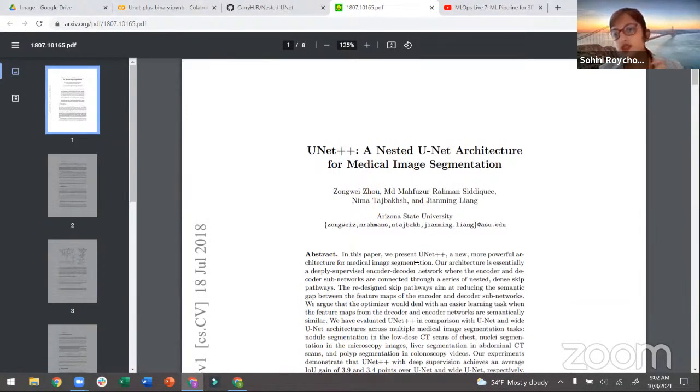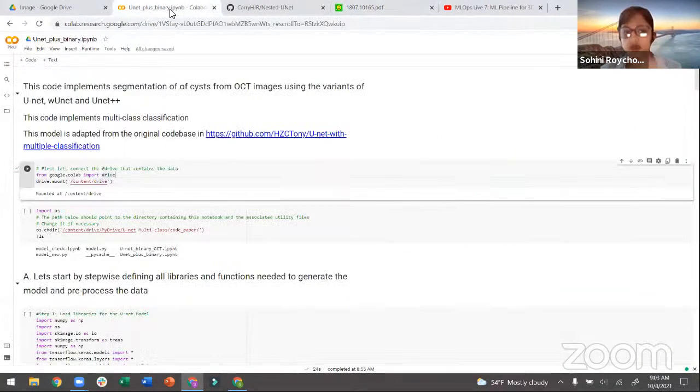So the computational complexity is a little higher, but the accuracy is also higher. You can literally see at every single stage how the performance is shifting. That's the reason why I chose this model rather than the standard Unet. And I am going to be going over every single step as it progresses.